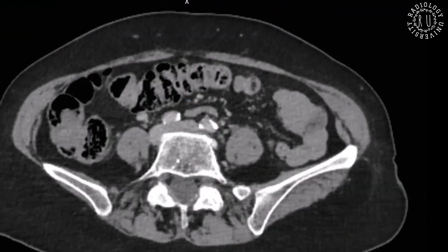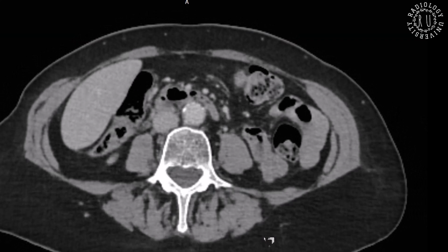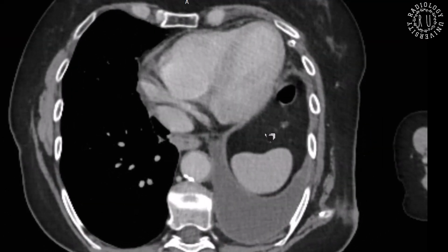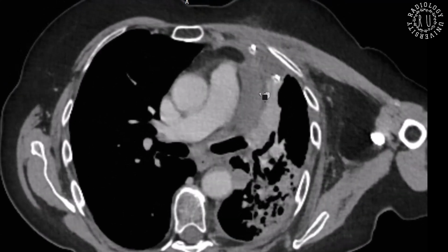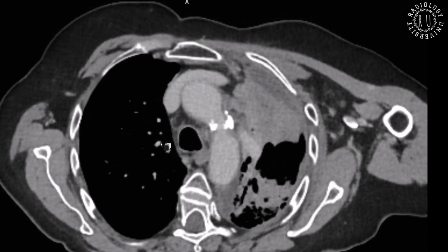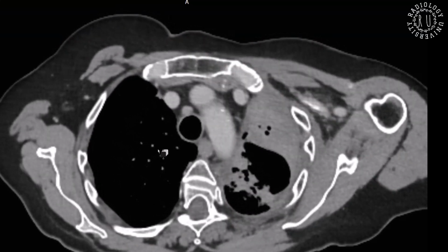And the biliary duct is also dilated. For the rest of the films, I also like to look at the mediastinal lymph nodes, which could affect the staging of this malignancy. There's only some short axis lymph nodes, but this one is slightly prominent.